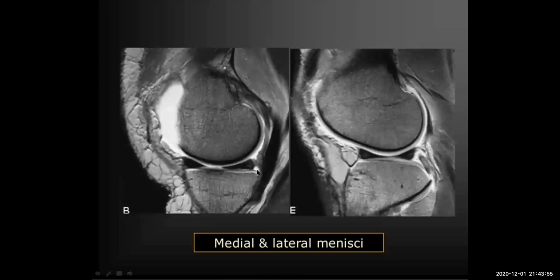We find that the medial posterior horn is bigger than the lateral posterior horn. So confidently I can say this is the medial side, where this is the medial femoral condyle, and any pathology that happens in this area I can interpret as located on the medial side, whether on the femur. This is the lateral side, and you have to look for the corresponding pathology on that side.